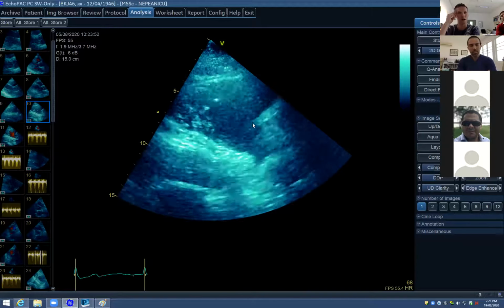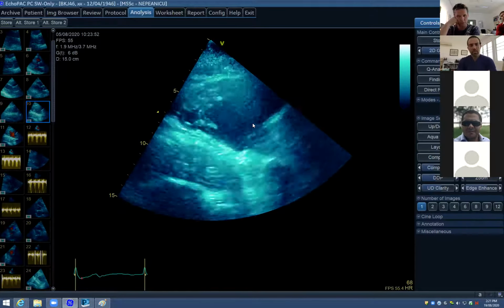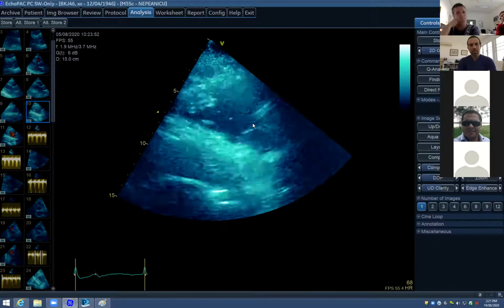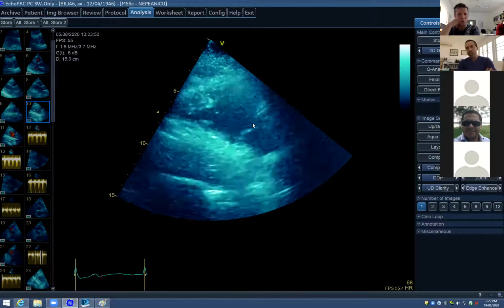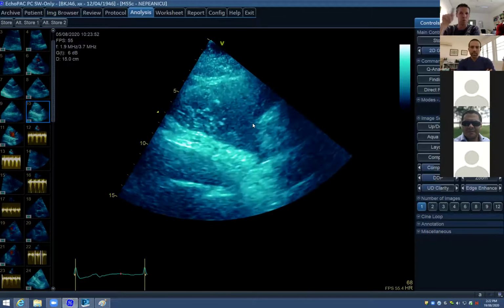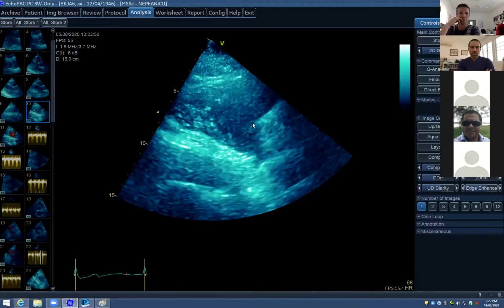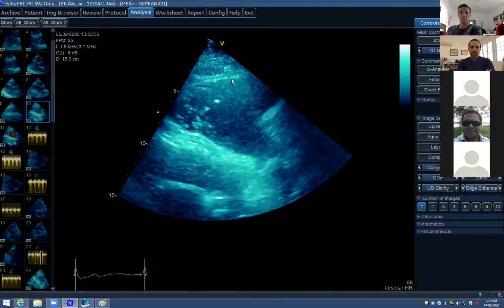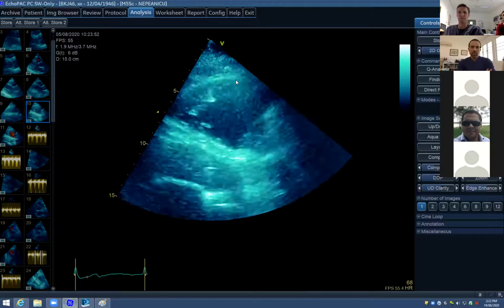That's exactly right. So we've got apical heavy trabeculation in the RV. And what does that mean? Well, it suggests that there's a chronic exposure to a pressure overload. So I'd be thinking, has he got long-standing pulmonary hypertension? And what would be the next thing that we could look at after the trabeculation? Well, I'd want to look for tricuspid regurgitation. Yep. Or the thickness of the wall. Look for hypertrophy. And what's abnormal? More than 6 millimeters, is it? Yeah, 5. Yep. 5. Okay.